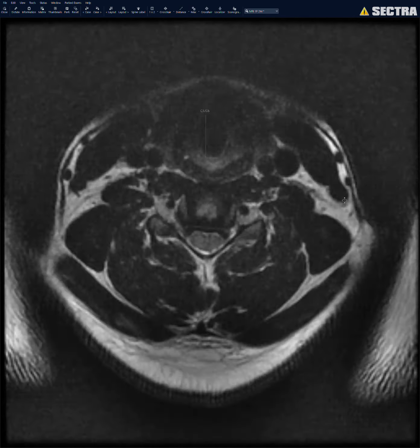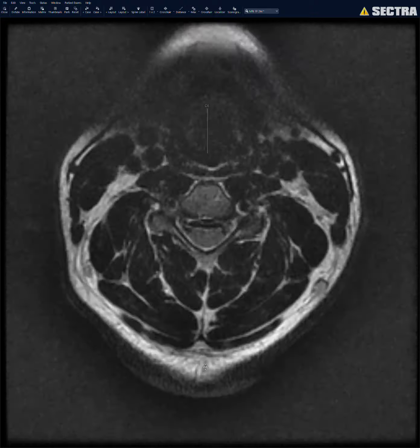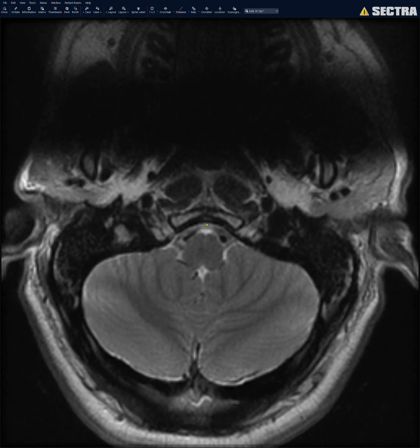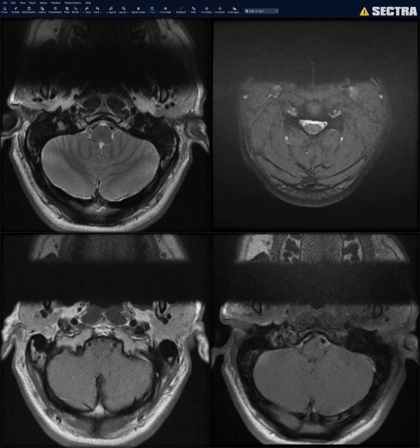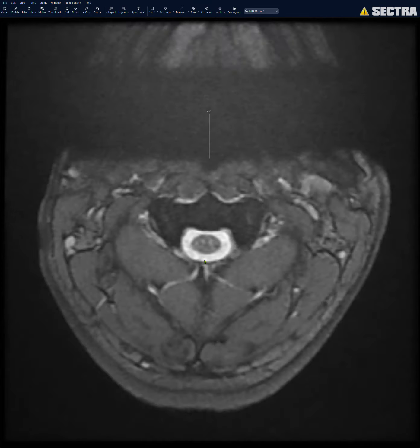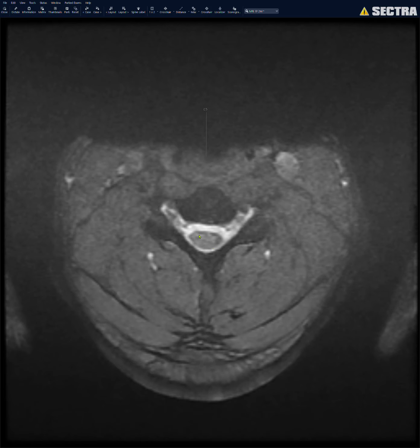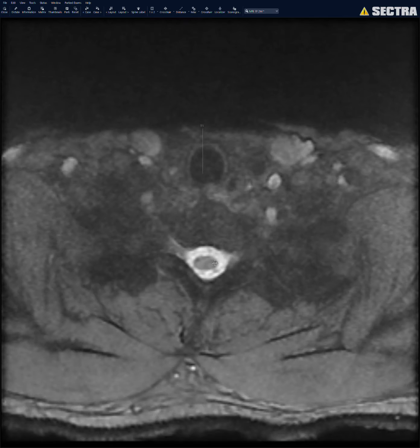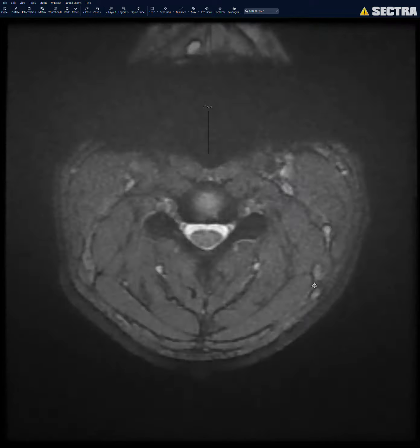And I look at the paraspinal soft tissues posteriorly. And so basically I'm reading it kind of like a CT soft tissue neck. And here's the GRE. I take a look for cord signal abnormality. This is, in the setting of trauma, good for looking at a hemorrhagic cord contusion. It would look like a black focus of hemorrhage in the cord. Okay, great. And I take a quick look at the soft tissues, look for any kind of abnormal edema.